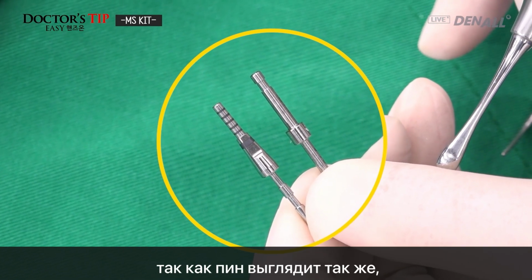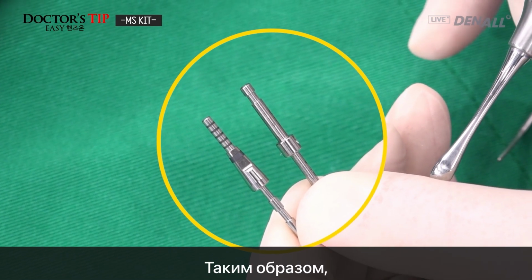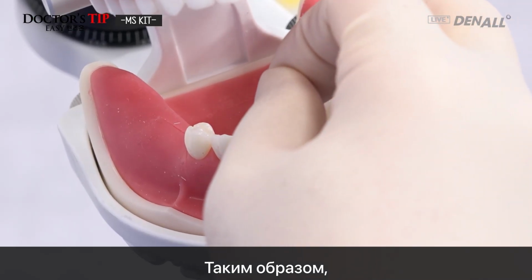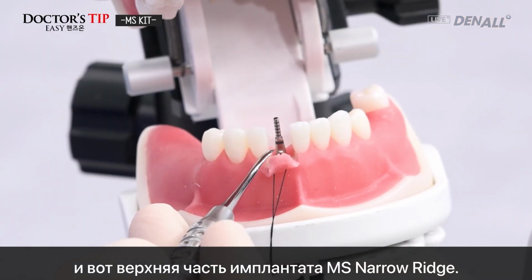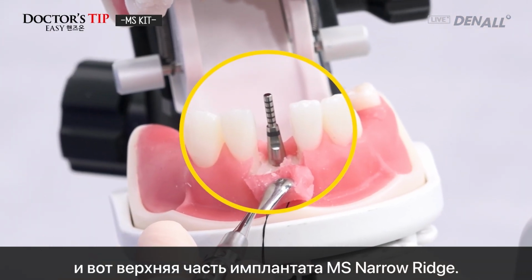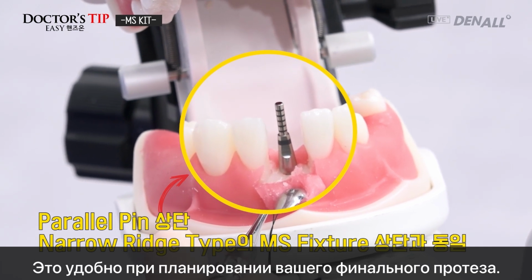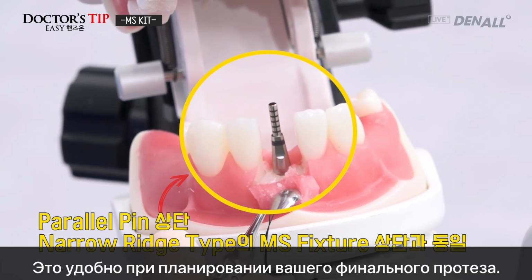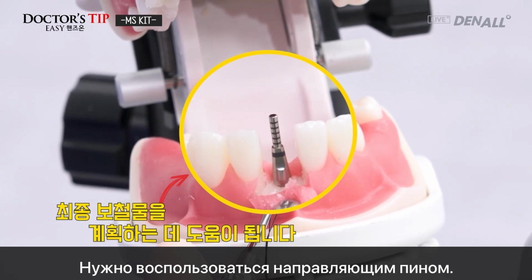Checking the final prosthesis, it's helpful because it looks the same as the implant. So you push in the guide pin, and like this, the upper part is the narrow ridge type MS fixture. The design is the same as I told you, so it's helpful in planning your final prosthesis.